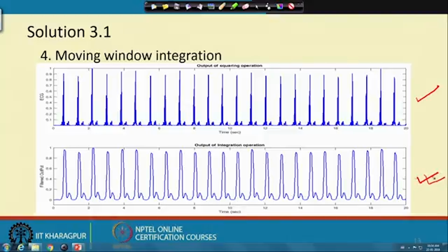Okay. So, the ragged peaks here become a post like structure, but one good thing happens, that it becomes a single post. So, for each QRS complex we have one post. So, that is the advantage we get following this step of moving filtering.